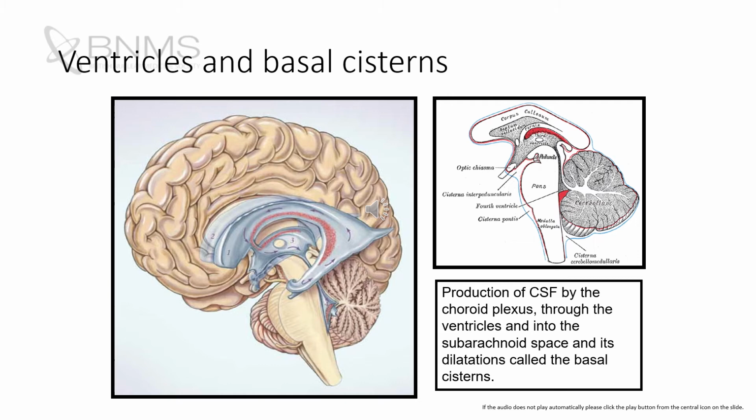The lateral ventricles are then going to drain into the slit-like third ventricle with its central massa intermedia.